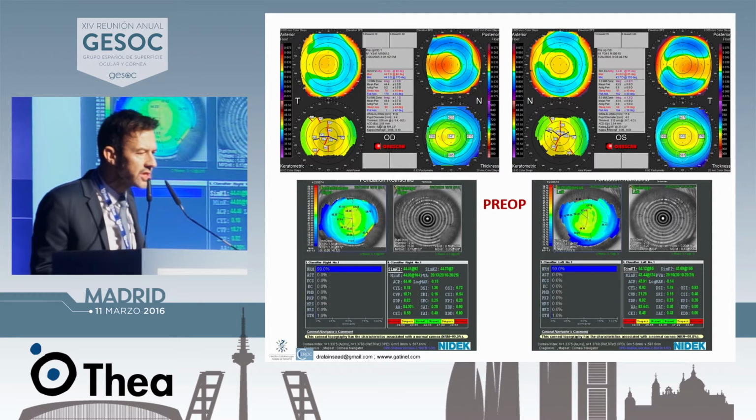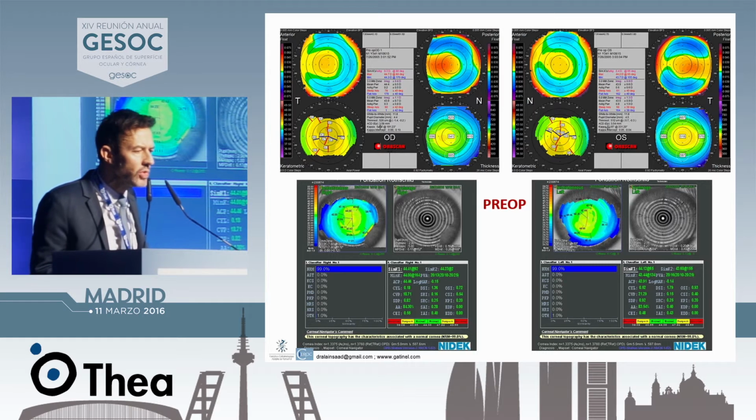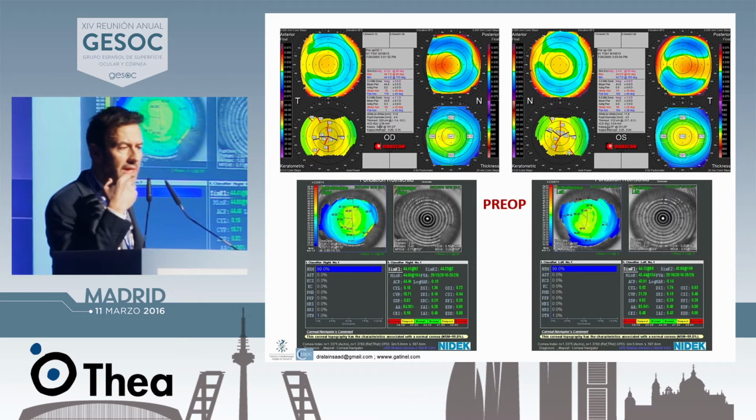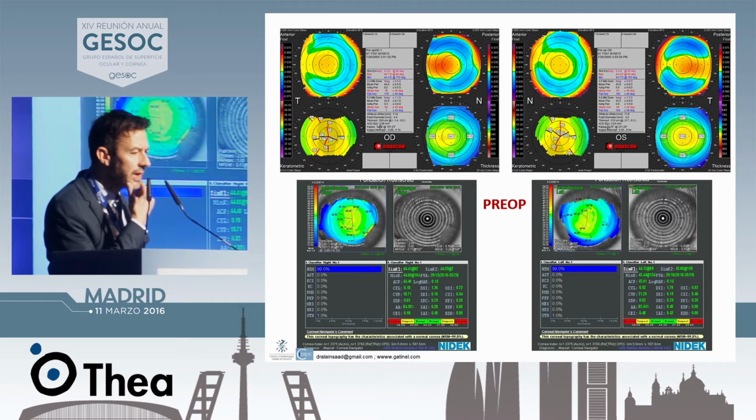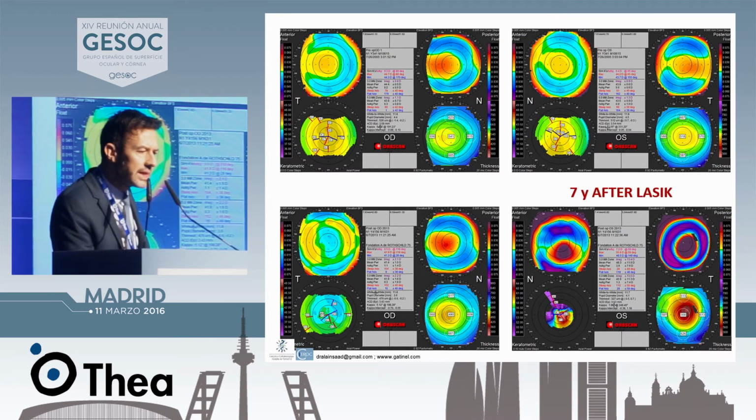So I would finish just with one example of a case, which is my case in 2005, which I saw for LASIK or PRK, and everything looked normal to me. Placido was normal. You can see indices there. And elevation, despite a posterior float which is quite red, would not really alert me. I did LASIK, and 7 years later got ectasia on the left eye. So you may think it was a high myopic error, but it was not. It was a -3 correction.